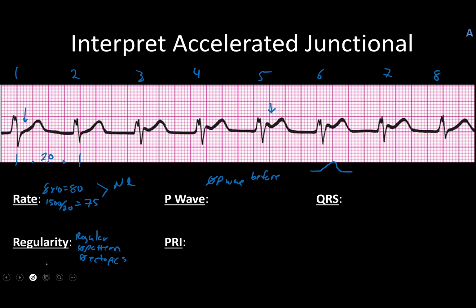And then I'll draw a P wave that's inverted that goes something like this. And so then when you put those two together, you get something like that, where the T wave has that negative deflection of the P wave pushing it down.